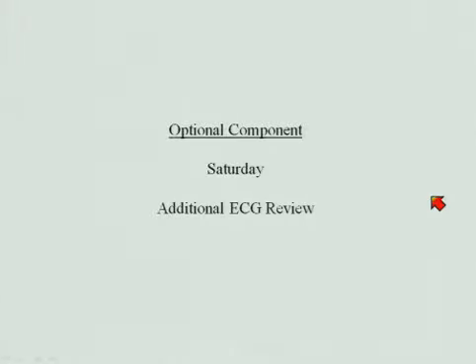So over the course of the review, the simulation, and the Saturday session, I will present to you about 145 electrocardiograms. They cover essentially all of the material that the board has indicated is testable from their standpoint, and I say that based on the board answer sheet that they provide to you. All the electrocardiograms I'm going to show you today are in your book. All of them are standard electrocardiographic diagnoses that any clinical cardiologist should be able to recognize.